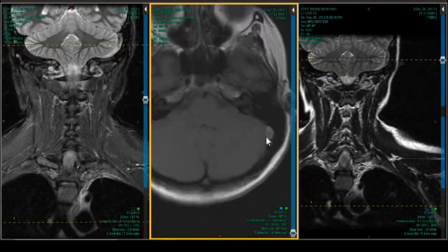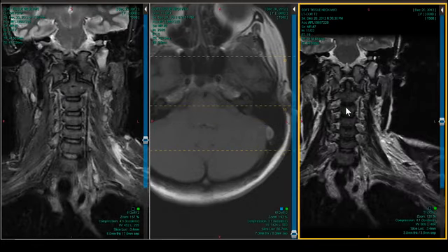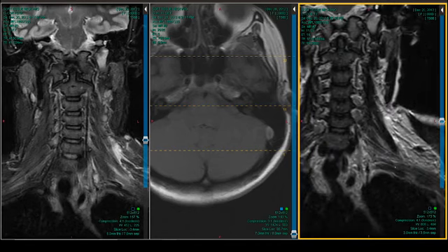And then you're starting to see a little bit of methemoglobin staining around the outside without pulsation. So that's probably out more subacutely. So that might have even preceded. It might have come from the top down into the jugular. Right. Yeah, these people with some sort of blood dyscrasia, or just anything can happen. You have to be imaginative to think of what could be going on with it.